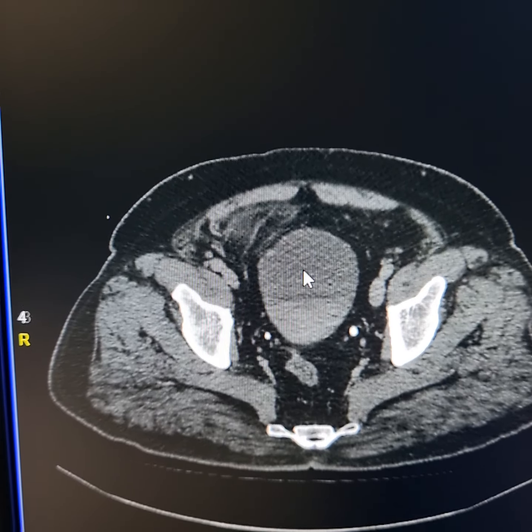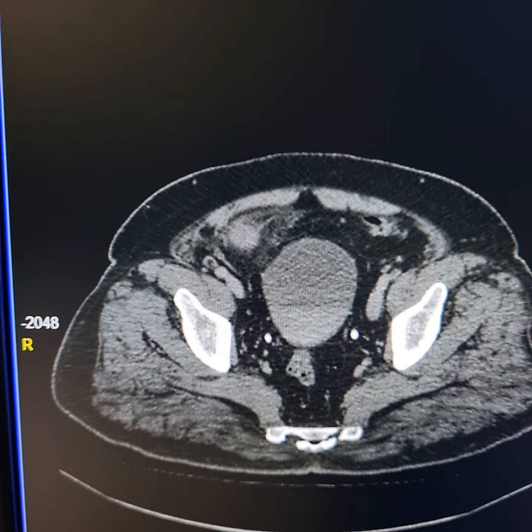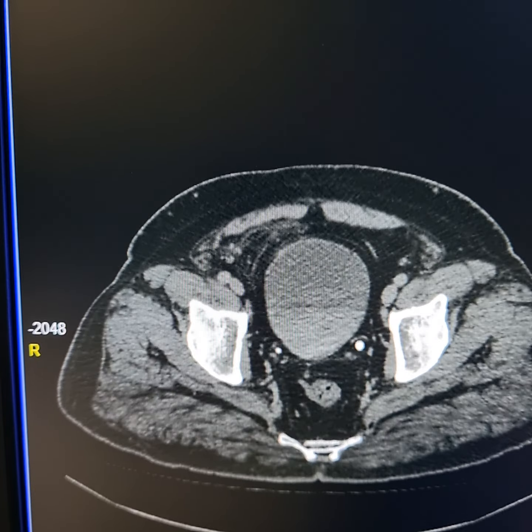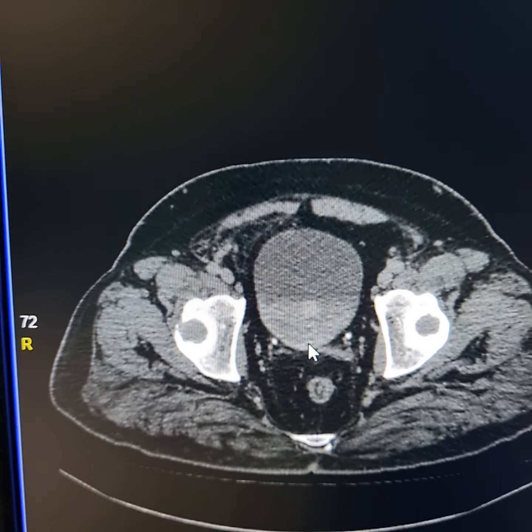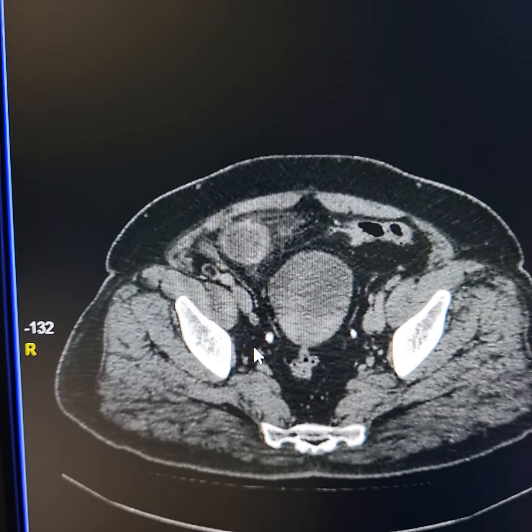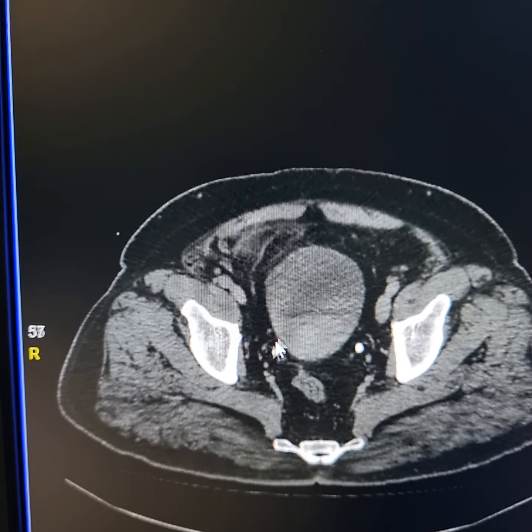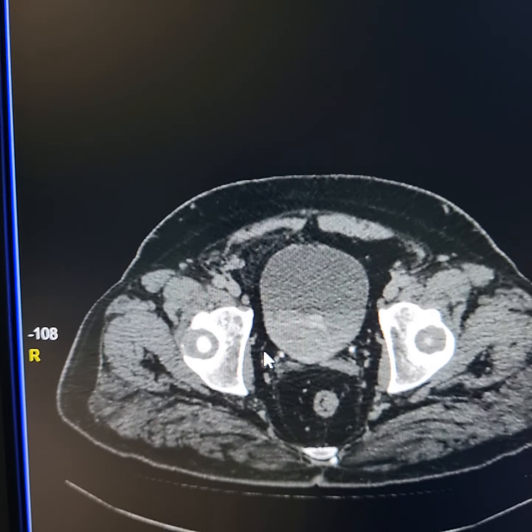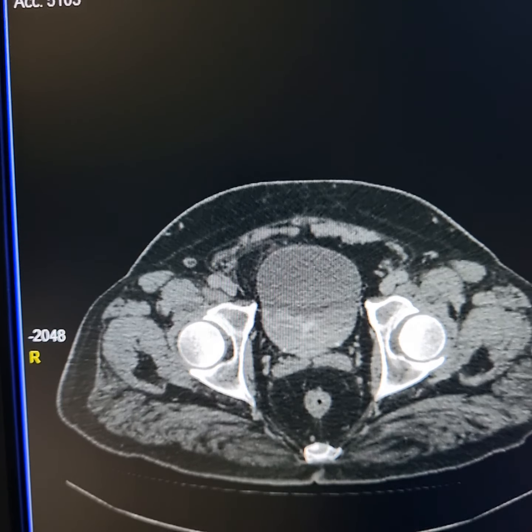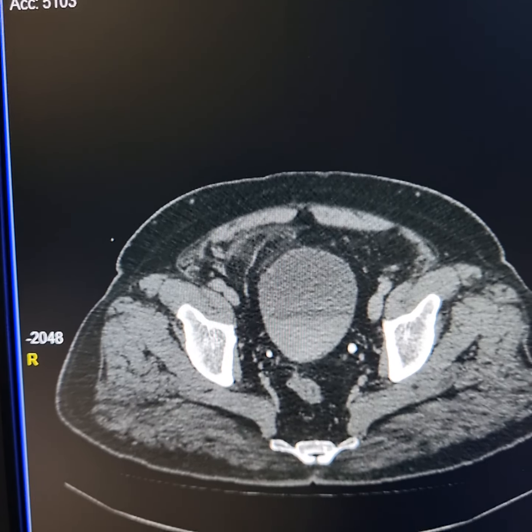The density of fat along the right supralateral border of the urinary bladder is also increased. There is thickening of peritoneum in the right half of pelvis, suggestive of inflammation. So this is the infected mucocele of the appendix.